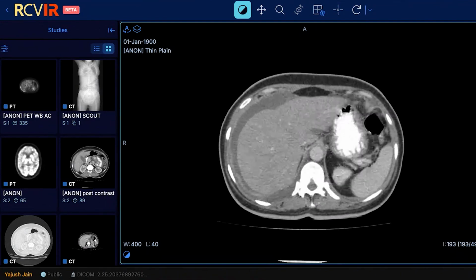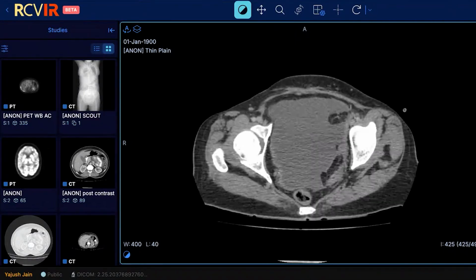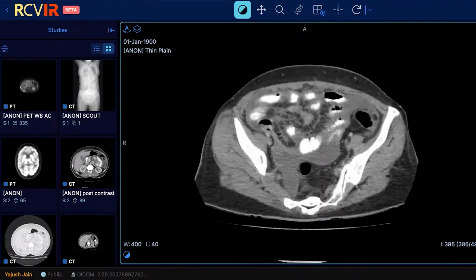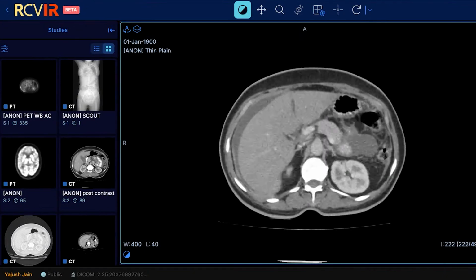Again, on the imaging, we thought we could see some adnexal lesion. So maybe this was an ovarian malignancy because of the raised CA125, but we could not see any obvious ovarian cause, no obvious adnexal lesion which could point out to that direction.